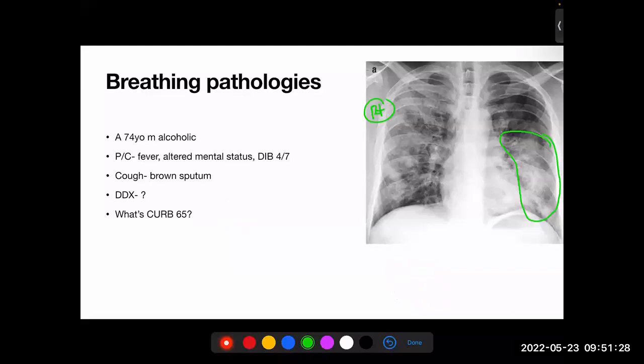I will show you Lobar pneumonia. What other things tell you this patient has bronchopneumonia as opposed to Lobar pneumonia? What are the patients who get broncho? Mostly the pediatric population. I agree with that. More. Look at this patient. How old is this guy? Elderly. And then he's alcoholic. So this guy is immunocompromised. So guys who are immunocompromised get bronchopneumonia.